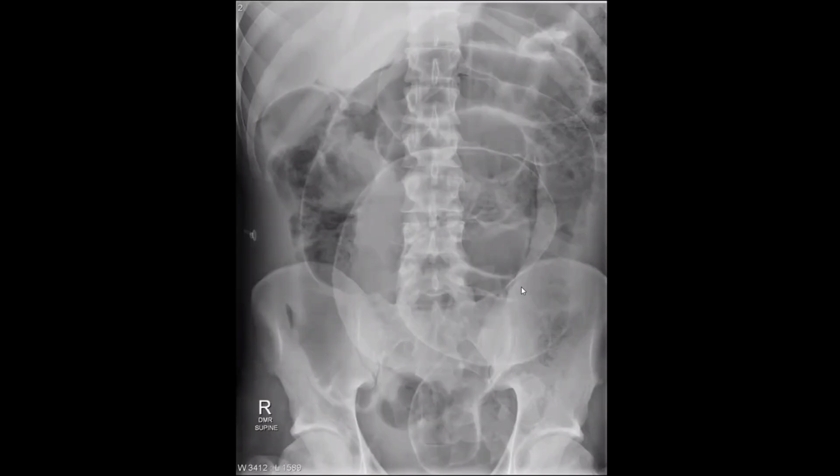We have different signs of pneumoperitoneum. We have subphrenic gas lucency. We have a Rigler sign, very clear. On the outer aspect of the serosal surface of the bowel loops, you shouldn't see a well-defined wall like this one. Once you can see a well-defined serosal surface, you are suspecting air outside and air inside: air outside is pneumoperitoneum, air inside is the normal air inside the bowel loops. So you can see the wall of the bowel loops very clearly. This is called the Rigler sign.